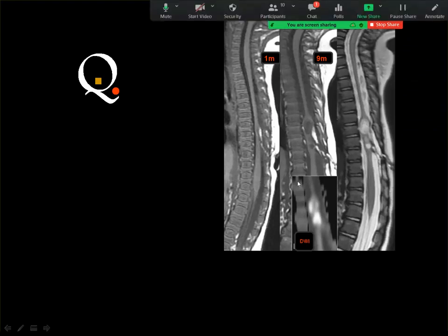And actually, if you look carefully, you see a dermal sinus, and this sinus connects the skin to the inside of the spinal canal. The dermal sinus may be associated with many of the dysraphic abnormalities. One of these abnormalities is the formation of a cystic lesion either in the epidural space, in the subdural space, or inside the substance of the cord.